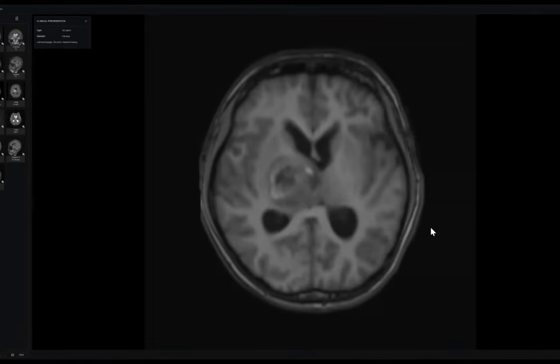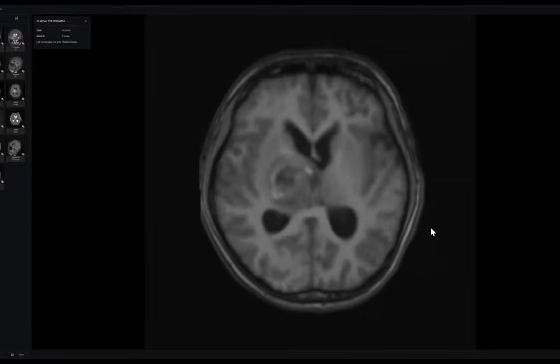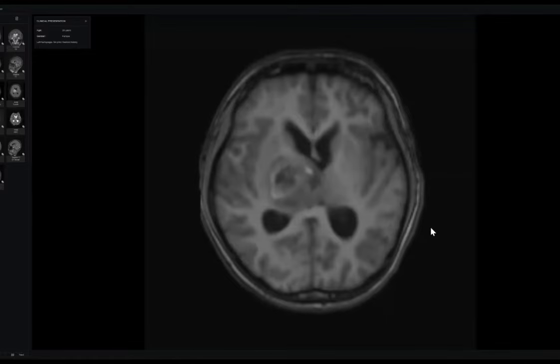Why? What is the clue that you are talking about glioma? Do you have any evidence? It is a highly vascular lesion, hyperdense on CT and high on T2.